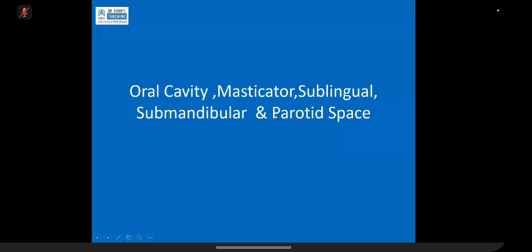Thank you, sir. Okay, candidate 4, are you with us? Yes, sir. Okay, so we are covering oral cavity, masticator space, sublingual. Masticator space we have already done, and parotid space we have just done. Basically, we have to do the oral cavity, which includes the sublingual and the submandibular space. Yes, please. What is this?